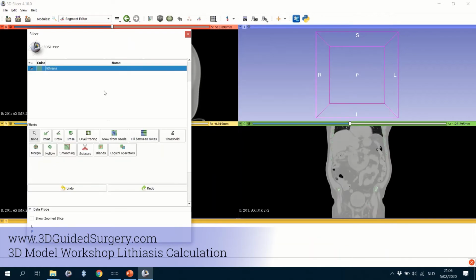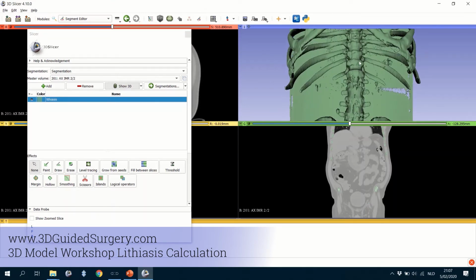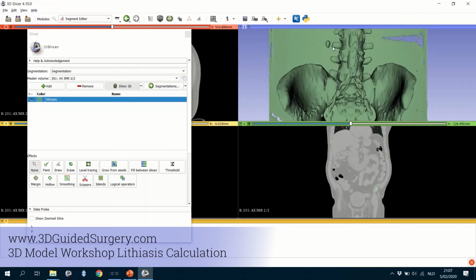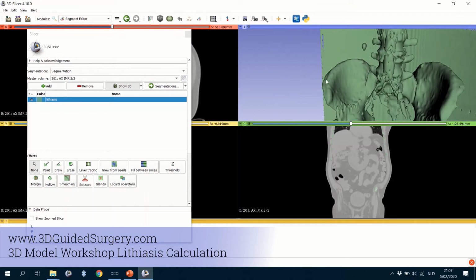So now it's saved here, and I will edit it in 3D. So I will click on, for this mask, show 3D, which will calculate the 3D volume and put it here. I don't see it, but that's because scans are often offsetted from the origin, which is in center here, because that's just how the machines work. And we see that the volume that we selected is here. So everything which is bony is still included. And here we see what we are most interested in. You see, you can turn it however you like.